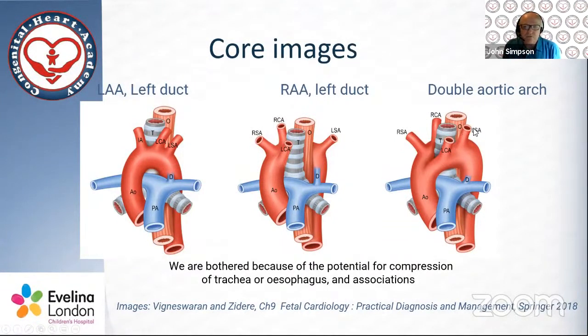And then we look at probably one of the simplest forms of double aortic arch, where we see an aortic arch passing to the right, which is usually the dominant aortic arch, and an aortic arch passing to the left, and a more symmetrical arrangement of the great arteries. In addition, there will also be the usual ductal arch. So essentially on the upper mediastinal views, you'll see 3 arches, and we'll see some pictures here.